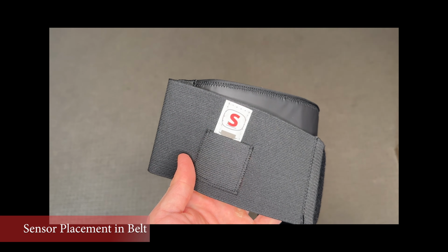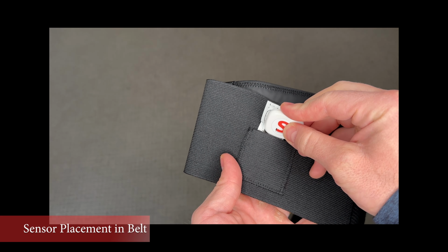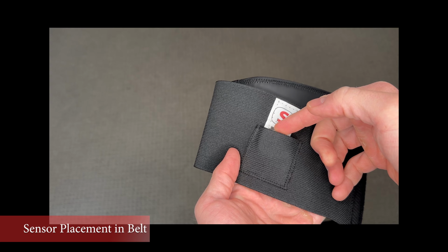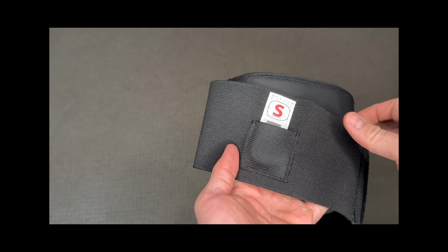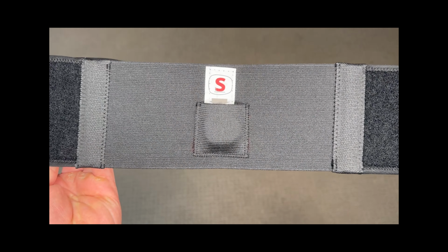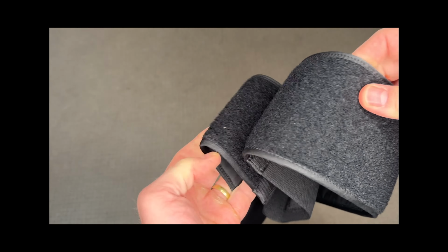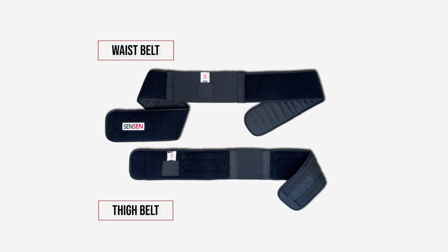Once the sensor is connected, it needs to be correctly placed into the belt. Both belts have the same pocket for the sensor and show how to insert the sensor, with the S oriented so that the black line is underneath the S, and the S faces away from the client's body. Once the sensor is correctly placed, the belt is ready for use.